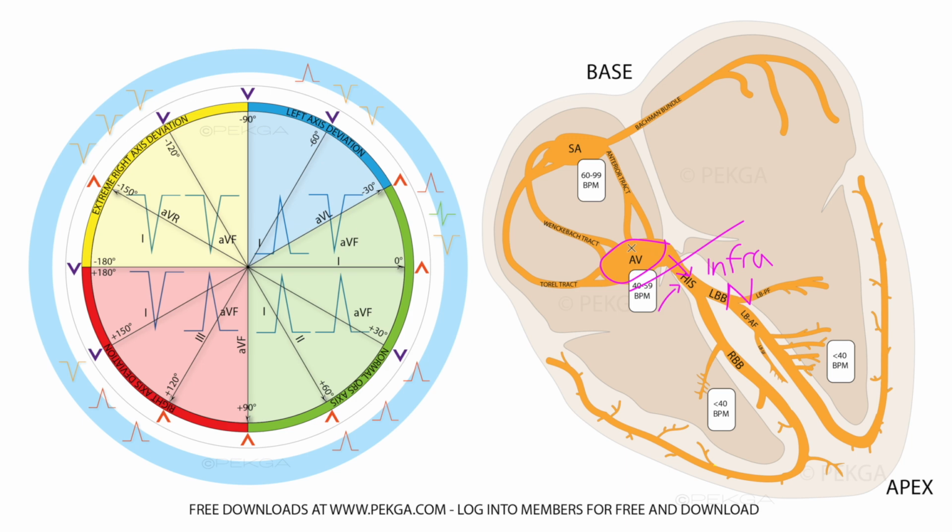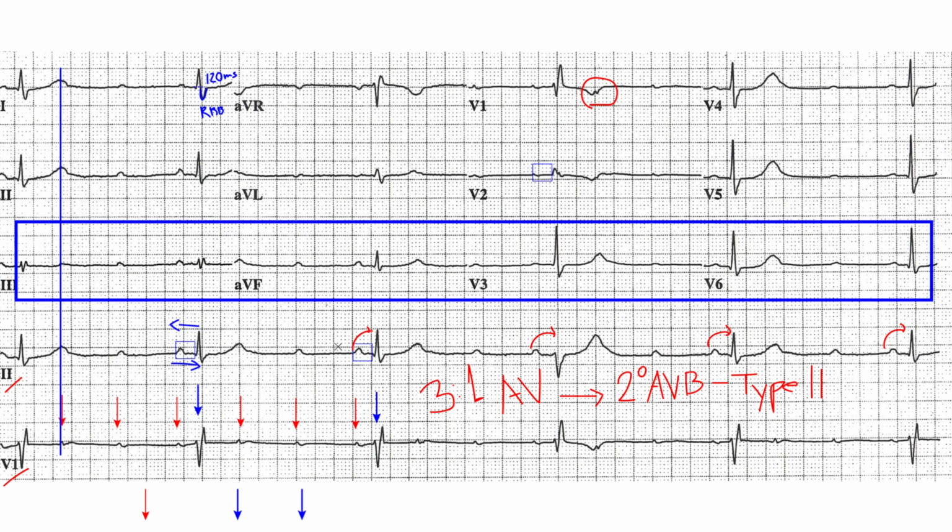Versus Mobitz-I, not to go into Mobitz-I here, but I am going to mention it. Mobitz-I works utilizing a different property, a different property of the AV node is being affected. But with Mobitz-II, it either happens or it doesn't happen. Okay, now let's go back to the ECG.